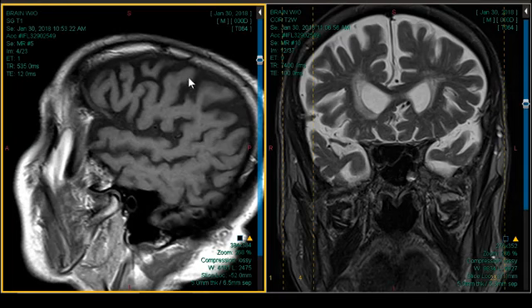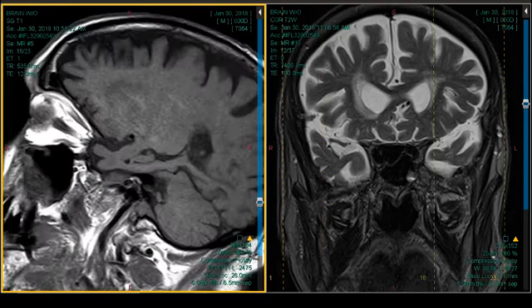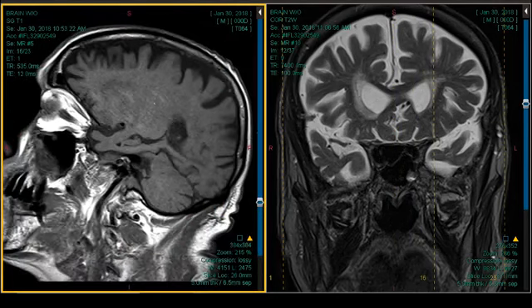Do we have parietal involvement? We have a ton of parietal involvement. Is it worse than the frontal involvement? It is. Let's go to the other side. I'll demagnify it. It's at least as bad, if not worse. I think it is worse.